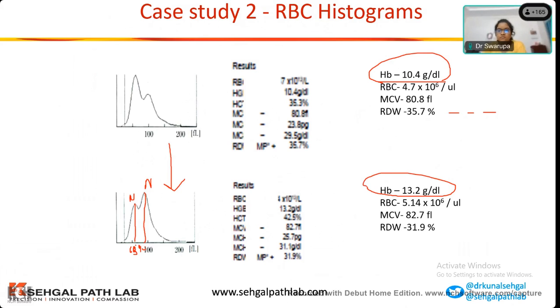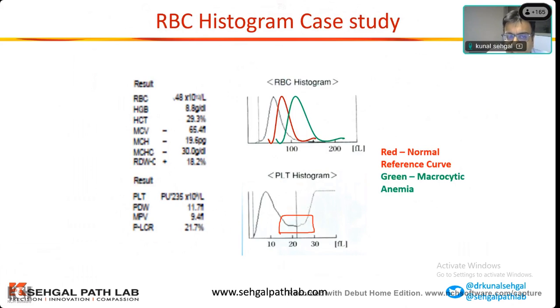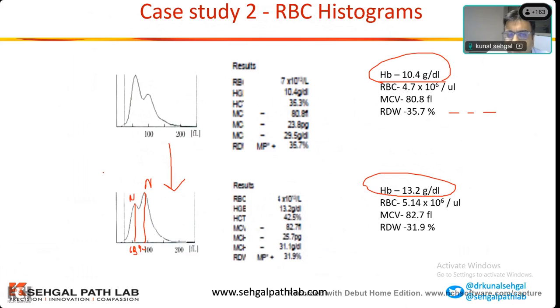Okay. So, sir, all the three plots which I showed you, starting from the first one, are of the same patient. This patient had a hemoglobin of 8, then was given iron and hematinic therapy. Normal cells started coming. But when we give hematinic therapy, what is the response in the bone marrow? Hyperplasia. What will come into the peripheral blood? Reticulocytes. And they are big in size.